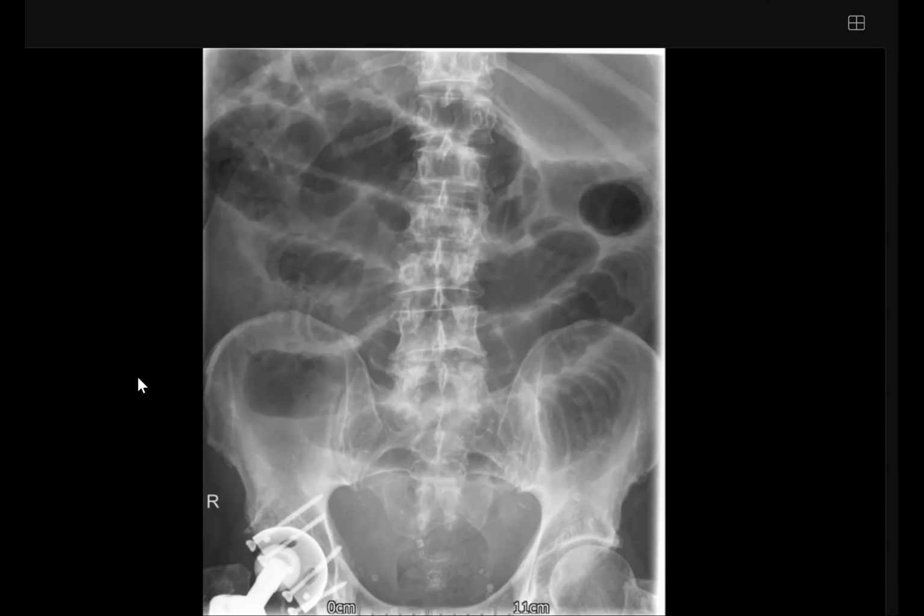The pelvis is relatively clear without any evidence of any calcific density. A few phleboliths are appreciated, however, no major other calcific density is appreciated. I can appreciate the surgical replacement of the right hip joint. Background bones show degenerative changes, so this is a skeletally mature patient. Considering this, I would immediately pick up the call as this is a small bowel obstruction.